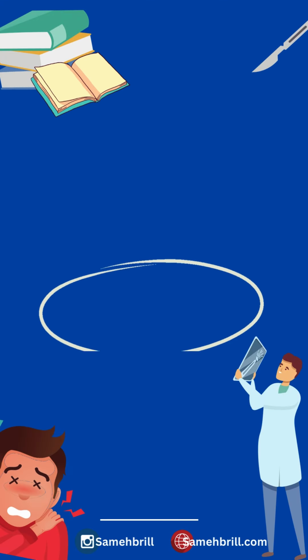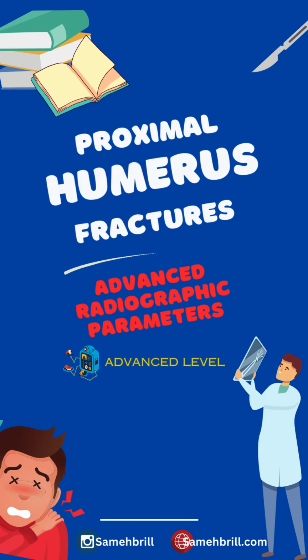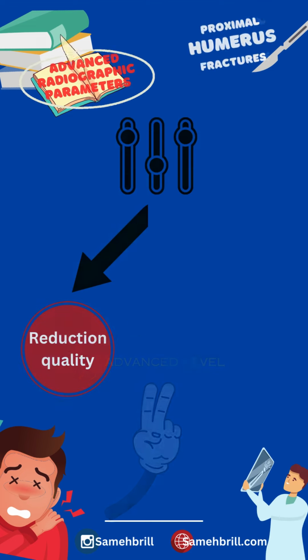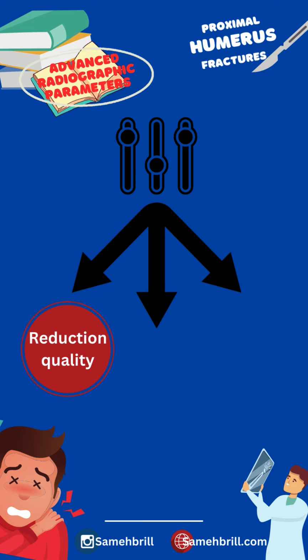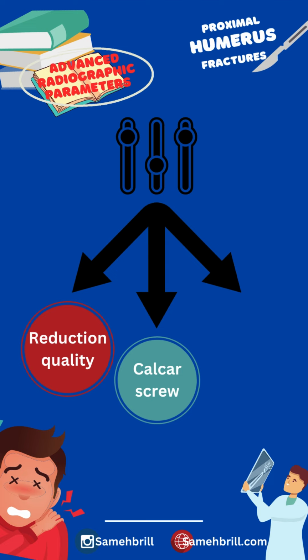Hey there, and welcome back to Advanced Radiographic Parameters in Proximal Humeral Fractures. In our last reel, we talked about reduction quality parameters. This reel, we're going to talk about calcar screw positioning parameters.